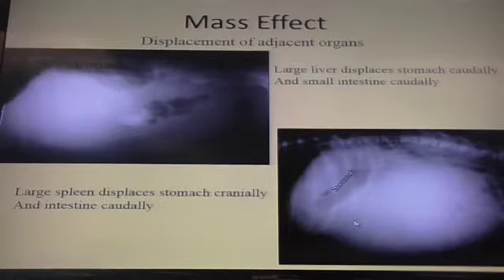Okay, so this is one where it's a soft tissue opacity located mid-ventral abdomen, displacing the stomach cranially, small intestine dorsally, intestine caudally. Then you would talk about, well, what lives here? Well, your first organ is going to be spleen. What's next? What else lives there? Kidneys tend to cause the bowel loops to displace ventrally. Now, you can put kidney, but I want to hear something else other than kidney first. What lives in the mid-abdomen other than spleen?